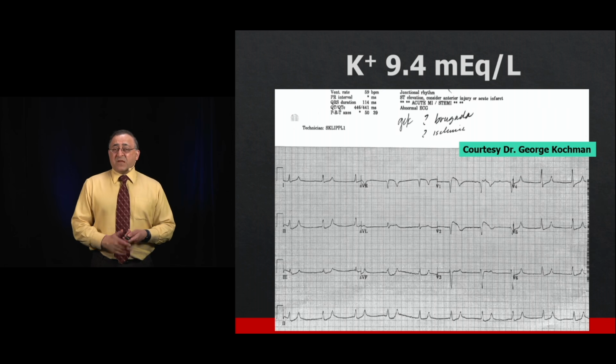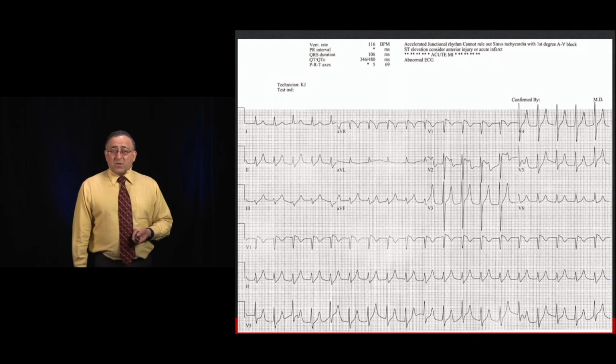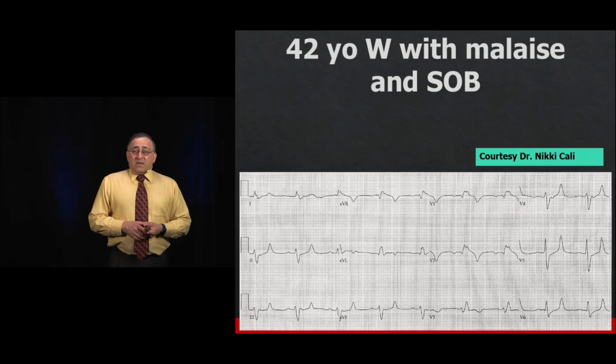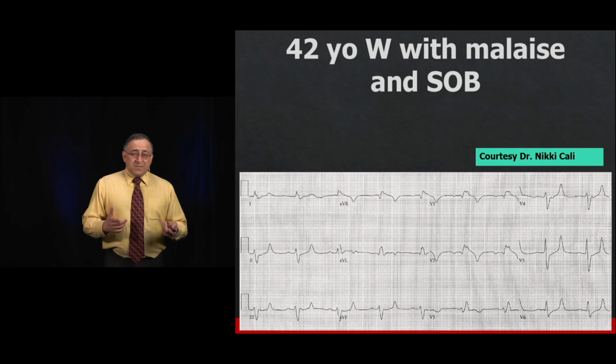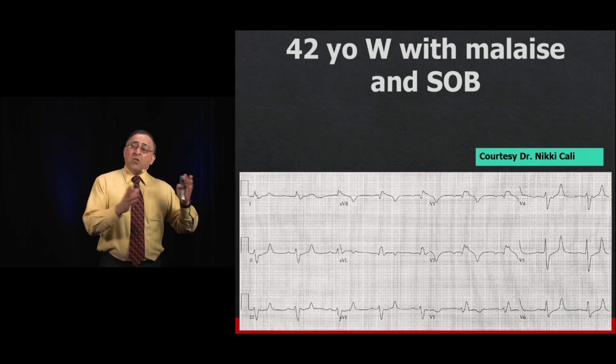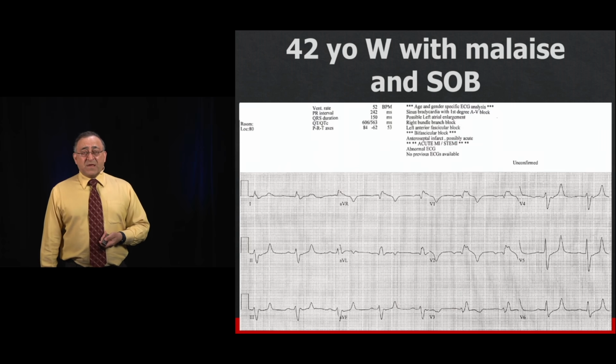That's your tip-off. This is just hyperkalemia. And yet another example: ST elevation in V1, V2, aVR, and nice peaked T waves. And this patient, same story. Again, hyperkalemia can be a little bit tougher because you don't always get the rightward axis, but you will typically get the peaked T waves, and so that's going to be your tip-off.